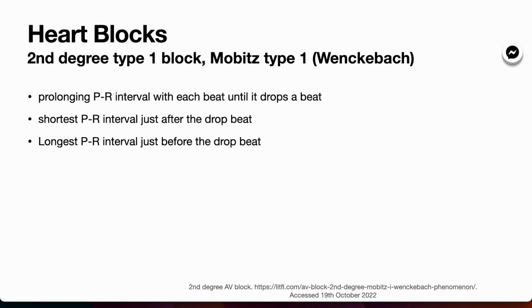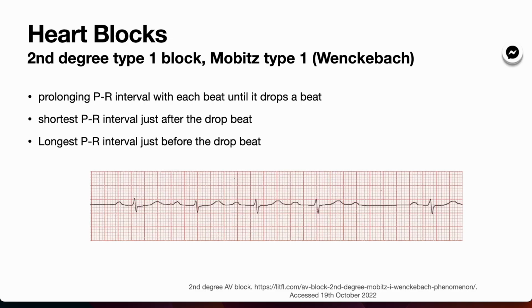So the shortest PR interval occurs just after the dropped beat, and the longest PR interval occurs just before the dropped beat. So what do I mean by this? Let's take a look at here.